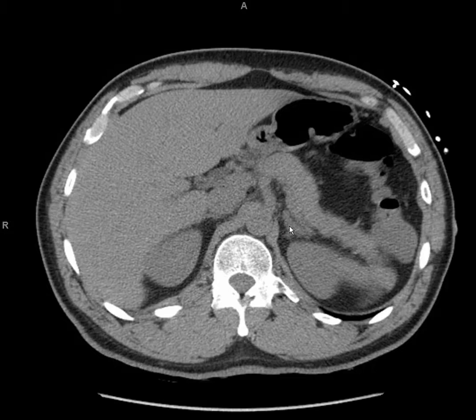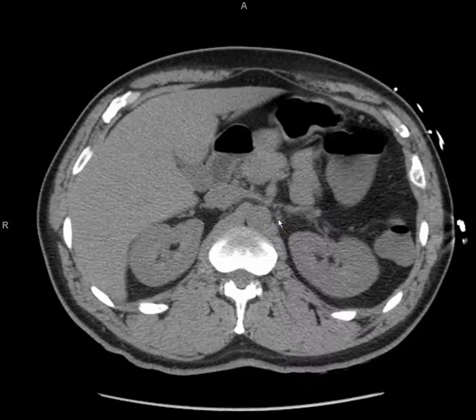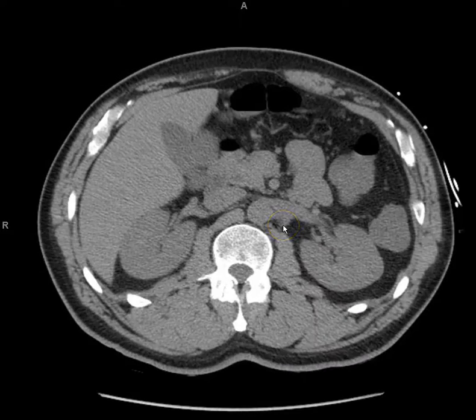And those are the adrenal glands. That's a normal looking adrenal gland. When the adrenal glands have a growth or a mass, then you would see a roundness there. Alright. So, what is next?